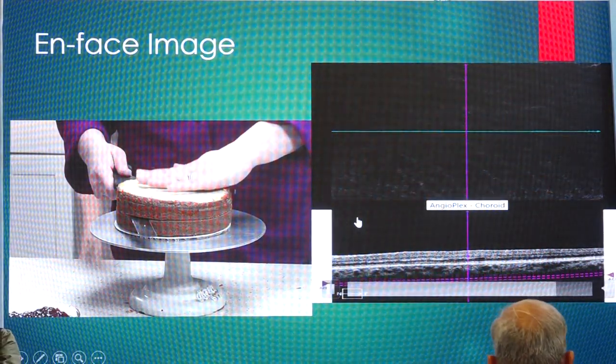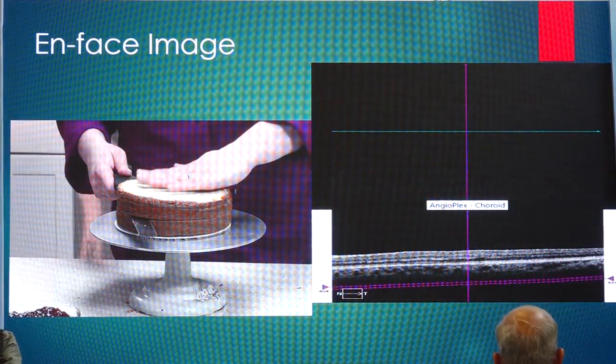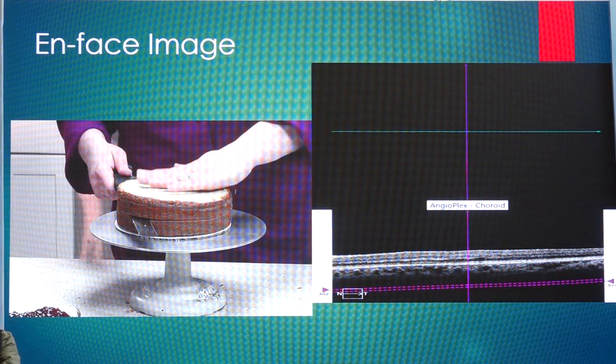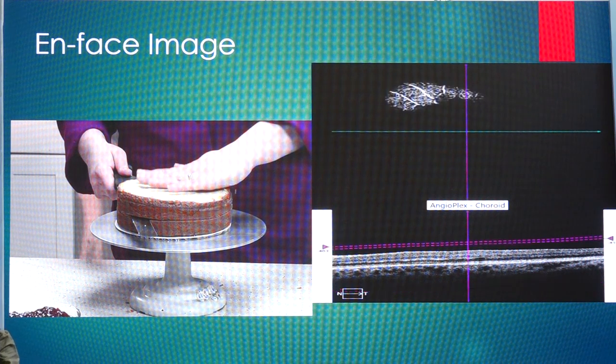So it's very important to learn here about the segmentation line, because a good segmentation, and how to do a good segmentation, will give you a lot of information over a period of time. The same thing we'll repeat in this video.